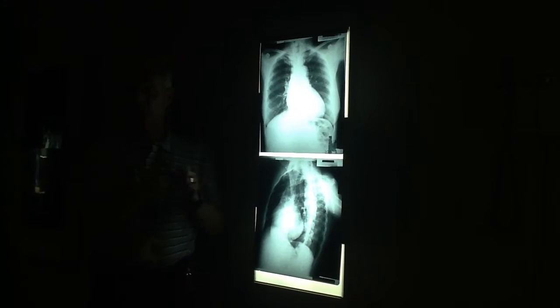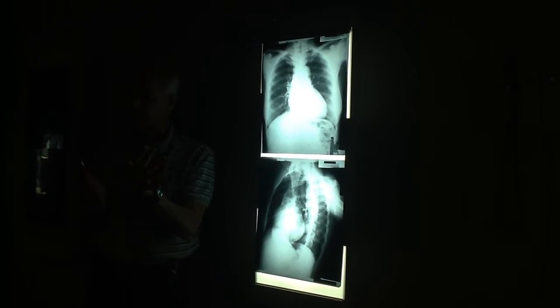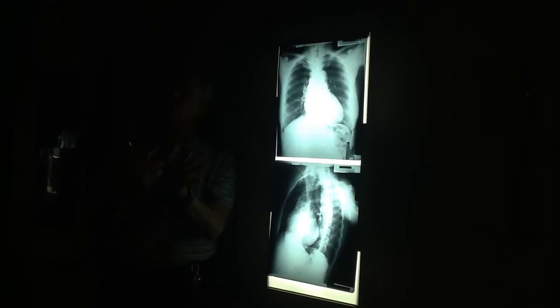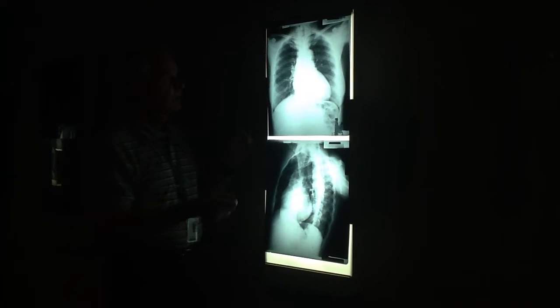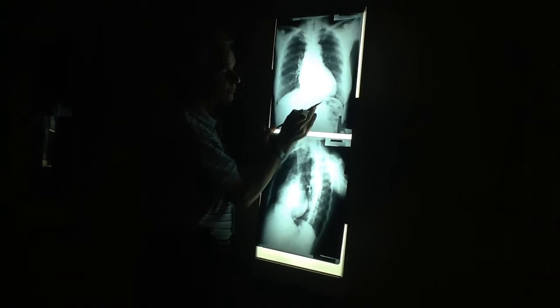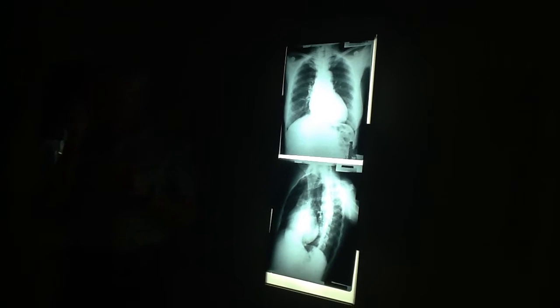What forms that? Well, right is right, front is right, left is left. It's got to be left stuff, remember? Because left is left. Back is left. Lefts are also both, always. Anything that's left is both chambers. So the left atrium's up here, but this is all left ventricle, isn't it? Very prominent. But here's what you have to remember.